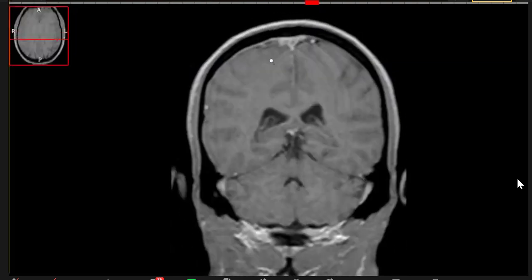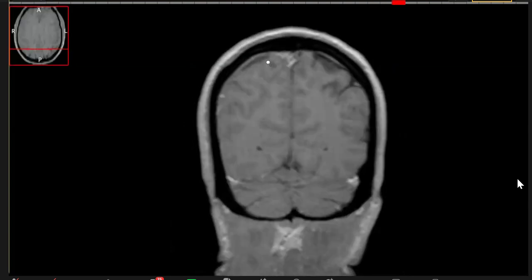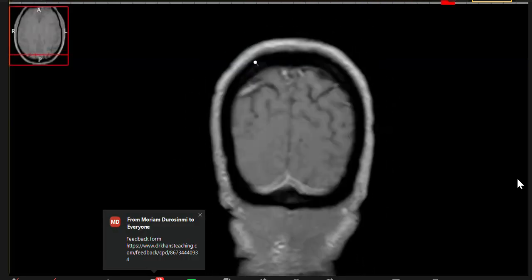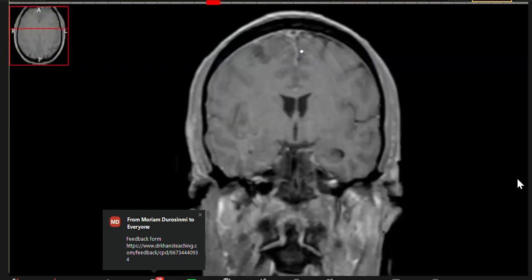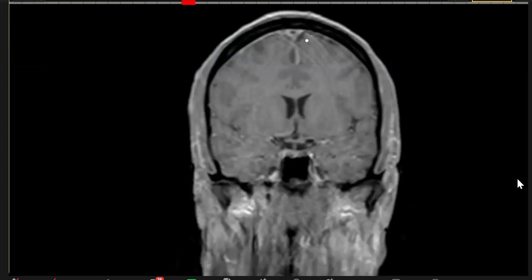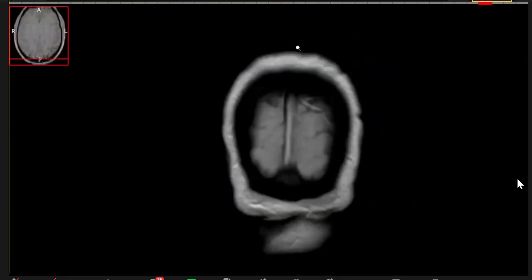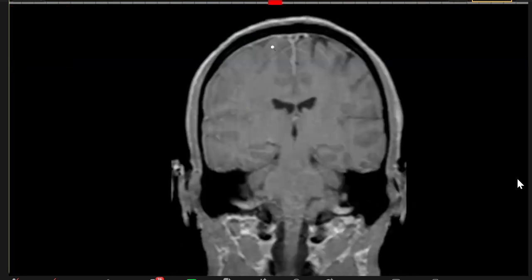And if we go now, here you are. Actually, I think this was picked up by the candidate: epidural. The word epidural or extradural was, I think, not coming to mind. So it is going all the way posteriorly. Look at the dural venous sinus. Look at this filling defect. What does it tell you? It means it is thrombosed. So here comes one mark. I would have given you one mark just for this finding.